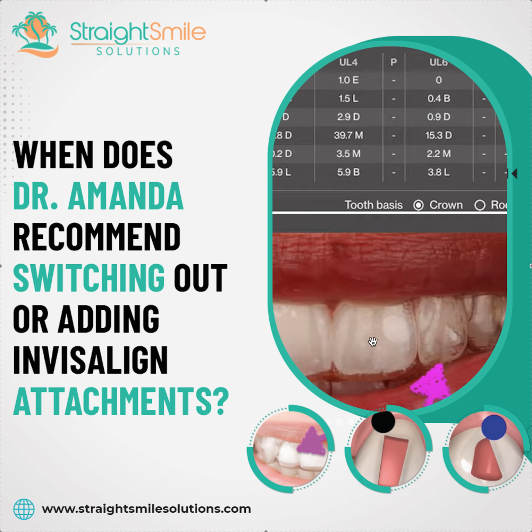I'm going to look for any black and blue dots. Okay, there's a sample of a black and blue dot. That is Invisalign's notification that it's a challenging movement on that tooth. I'm going to hover my mouse over that black and blue dot, and it's going to tell me what it is. If it's an intrusion, still might be challenging, but probably doesn't need an attachment. But anything else, torque, root correction, rotations, extrusion, that needs a massive attachment.